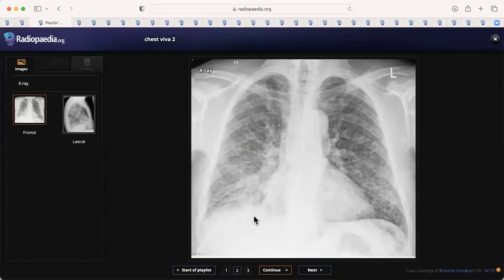So this is a case of miliary TB. I'm just going to touch a bit on the management. You need to express to the examiner that this is an urgent finding because the patient needs to be isolated, and they do public health notification here in the UK. He needs to be investigated with sputum and bronchoalveolar lavage for acid-fast bacilli, and they need contact tracing as well as public health notification. Those are the steps they take here for TB. So this is a case of miliary TB.